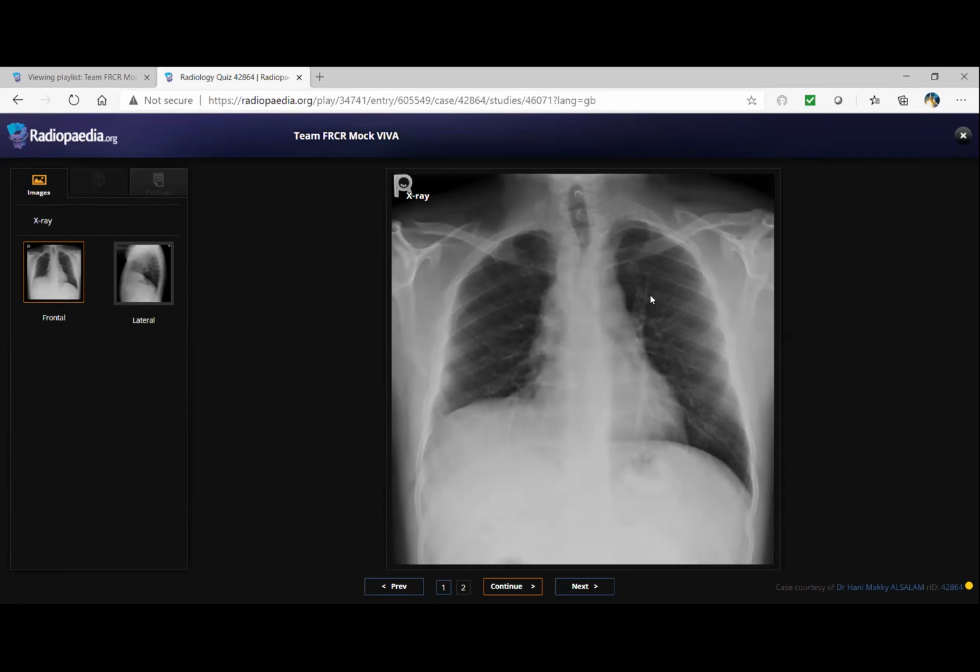I'll check the patient's clinical history, whether this patient is acutely unwell with dyspnea or any stridor. This patient is presenting with progressive dyspnea. Yeah, if this patient is having progressive dyspnea and stridor, then this needs further evaluation to find out the cause of this tracheal narrowing and some volume loss in the right hemithorax. I'll compare the previous images to see whether it's an acute or chronic finding, and we'll also refer this for a CT chest for further evaluation.